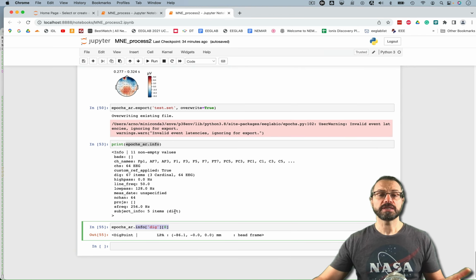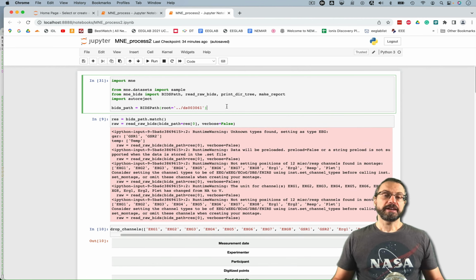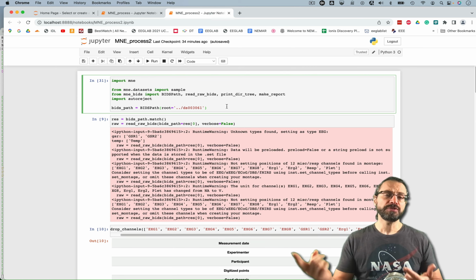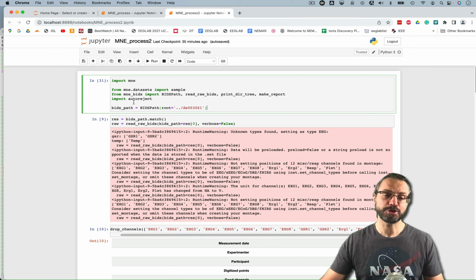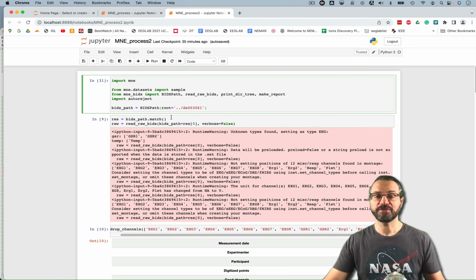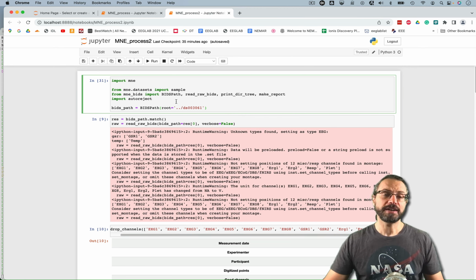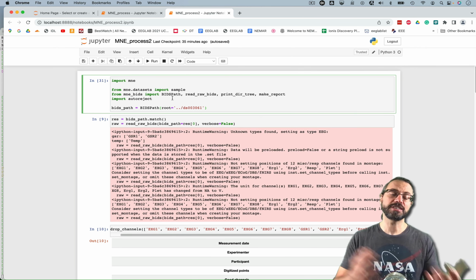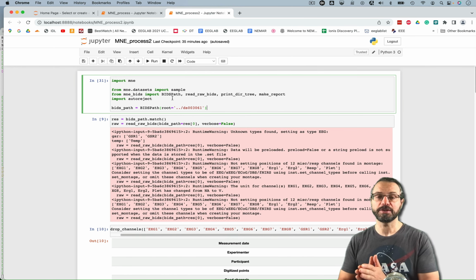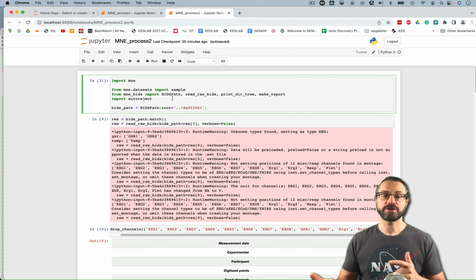The last part I want to mention is about using a notebook versus the MATLAB command line. For people who are familiar with MATLAB, even though I can copy and paste code, if I want to start a loop right now across datasets, it's not that simple because everything needs to be in a block. I would have to create a single block, copy everything within it, and then create a loop. So for the MATLAB user, it's just not that flexible. And if you have something in the loop afterwards, everything is indented, so you can't copy and paste onto new cells anymore, because you have to de-indent everything or indent it properly so it's executed properly. That's what I personally don't like about the Jupyter Notebook compared to the MATLAB interface.